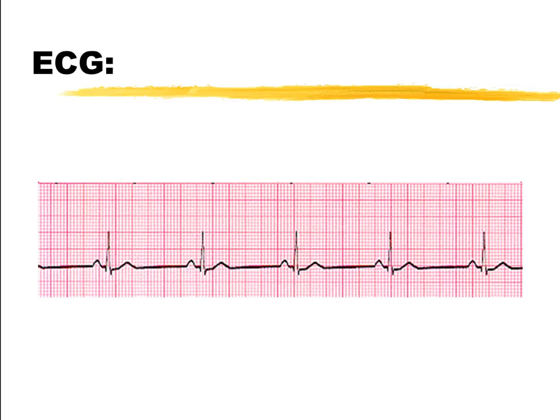This is what it looks like on the ECG. So if you remember back to those things that I mentioned before, you can see that there's the rate. If we count it up here, this is a 6-second strip. These little hash marks here are seconds. So 1, 2, 3, 4, 5, 6. Roughly we have a little piece over here. So it's about a 6-second strip. And we count those, 1, 2, 3, 4, 5, my great method. Then it's 50. We know that's less than 60. It's the normal parameter, at the bottom of the parameter. So now we have a rate of 50.